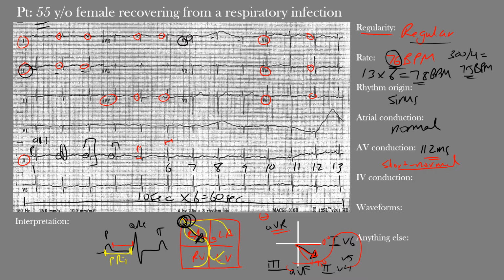So next we have the intraventricular or IV conduction, and here we look at the duration of the QRS complex, or that QRS interval, and normally it should be between 80 and 110 milliseconds, or 2 to 3 small boxes. Okay, the main thing we're looking for here is that intraventricular conduction should not be prolonged. So really you don't need that lower limit, but again, we're looking for something that's not prolonged, so we're not dealing with any intraventricular conduction delay. Now we can see narrow QRS complexes that appear within normal limits here.